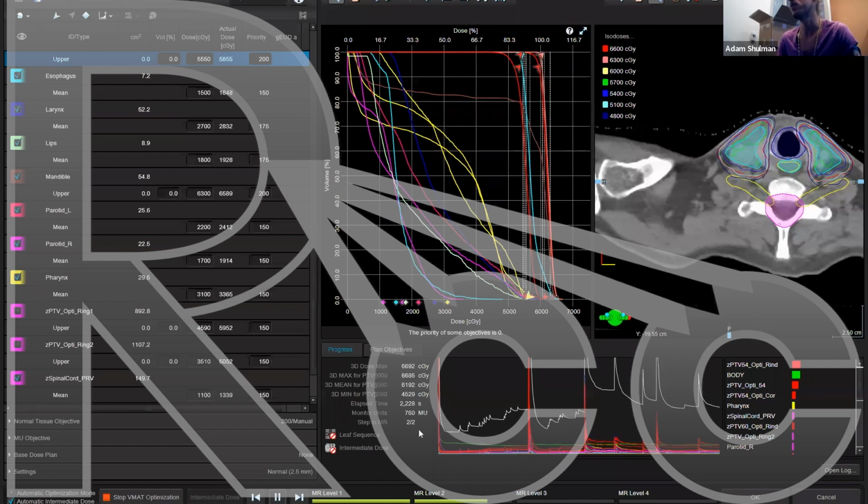This was also covered, but for the same photon fluence delivered, so the same MLC shapes, if you deliver a plan, calculate it in type B, and then calculate that same plan in type C, the dose to the bone will appear 3 to 5% low. So if you're optimizing in type C and you get the same dose distribution that you get in type B, that means that you're delivering about 3 to 5% more bone dose or mandible dose than you would historically using type B.